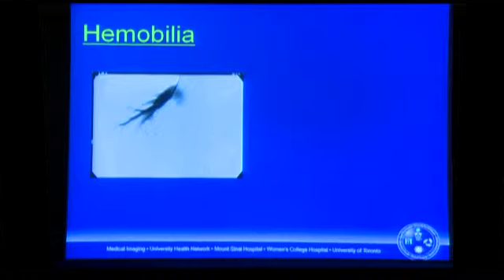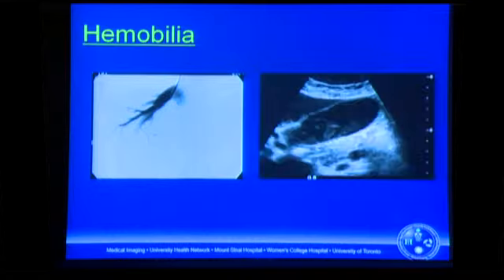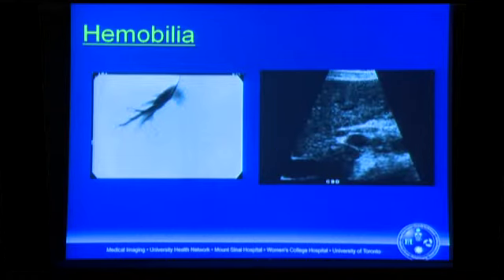This patient had a transjugular liver biopsy and returned within 48 hours with a history, rule out acute cholangitis. And what this patient has, of course, is blood in the gallbladder lumen and blood in the CBD from bleeding following the transjugular liver biopsy.